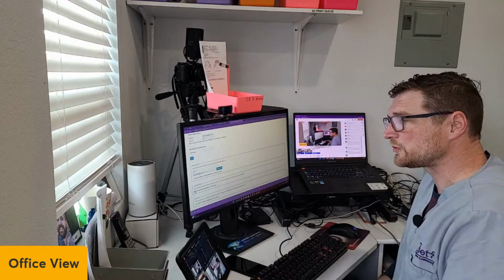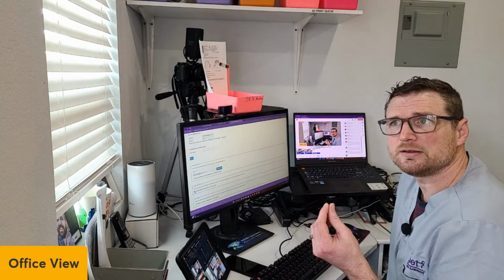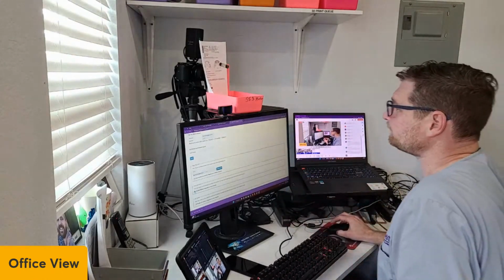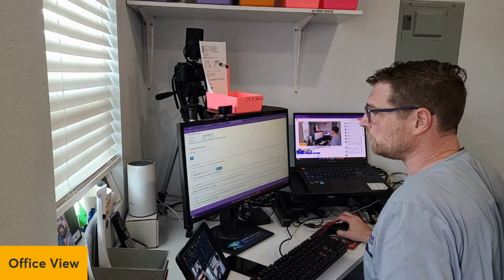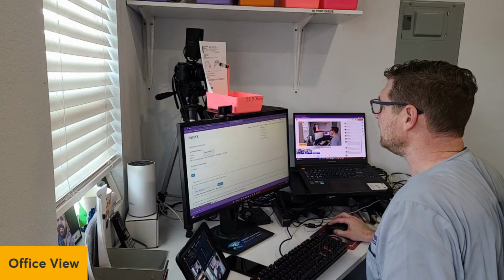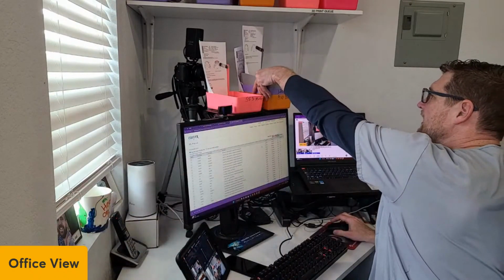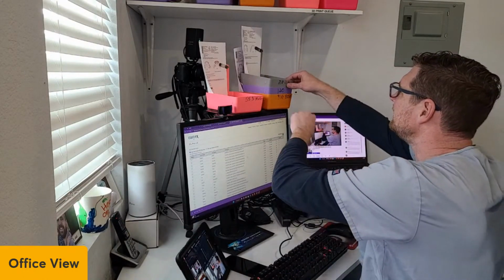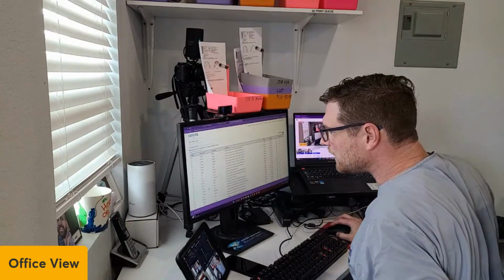Preform is the nesting software for Formlabs, and it does a really good job. So I've activated that now. I'm going to go back to my STL print list. I've got to redo this. Like I said, it usually goes faster. So let me get this checked off real quick while I'm on this screen.